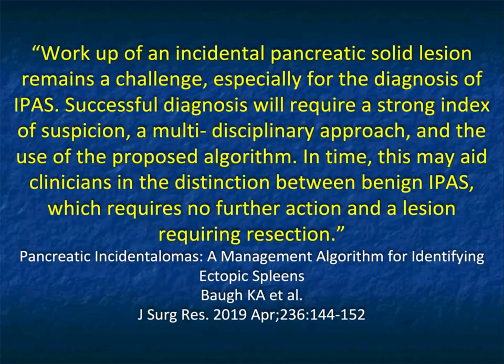Now, when I look at accessory spleens versus neuroendocrine tumors, generally neuroendocrine tumors are more vascular, but that indeed varies. The biggest thing is if you have the spleen and the tumor, or the suspected tumor, in the same slide or nearby, the neuroendocrine tumor is usually more vascular, but beyond being more vascular, it doesn't have that same moire enhancement pattern.